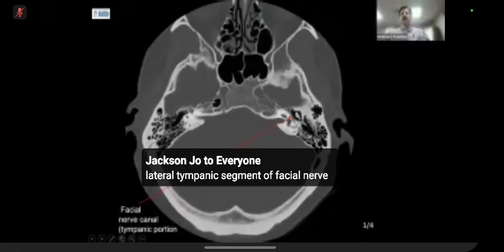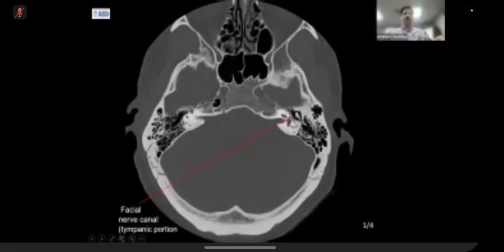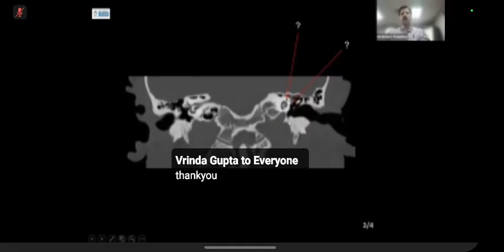This is a hint. And okay, that's the semicircular canal, but it's the lateral one, the lateral semicircular canal. Excellent, excellent, well done. Now, these are the two owl's eyes, right? Just like your cholesteatoma case, which you saw. This is the medial, this is the lateral. What is this? What is this? Over to you. This is the same question which I asked in your cholesteatoma case.